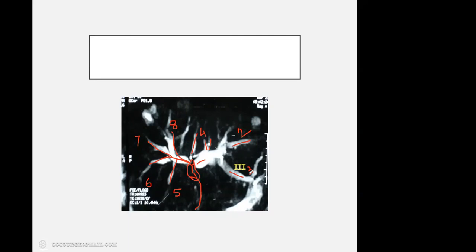But we could also see the other structures like the liver, the spleen, stomach, vertebral body, the rest of the things on that axial image. So that is T2 weighted, and this is heavily T2 weighted, meaning we can only pick up the fluid containing structures and nothing else. See, in this particular picture, you barely see anything else apart from the dilated bile ducts.